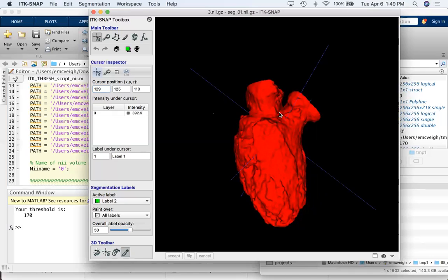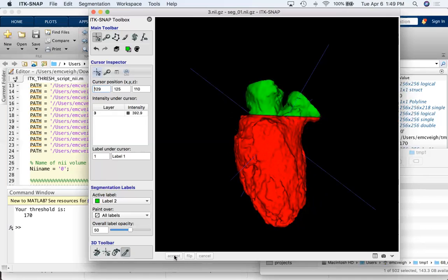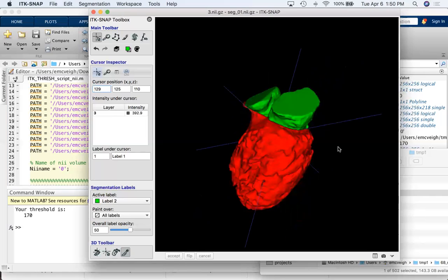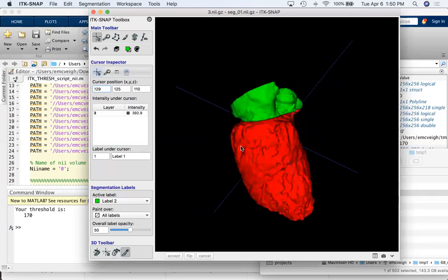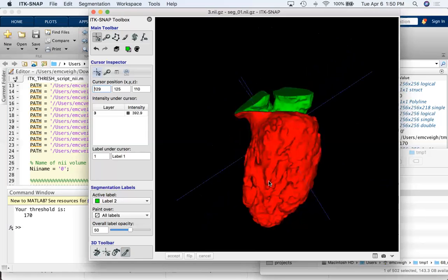And the reason I like doing it this way is because it's so much faster than hunting around and doing it interactively for each frame. So you can do everything in about 2 minutes. You'll do them all, and you'll create this line in all of them. Right? And so we did 4 of them in about a minute, right?